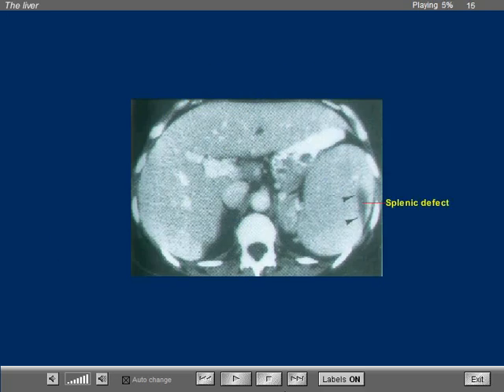When a liver enlarges, the left lobe can reach the left abdominal wall and grow laterally, cephalically, and caudally. It can almost embrace the spleen. And in this patient, there was a defect in the region of the spleen, which was initially misinterpreted as possibly representing an area of splenic laceration.